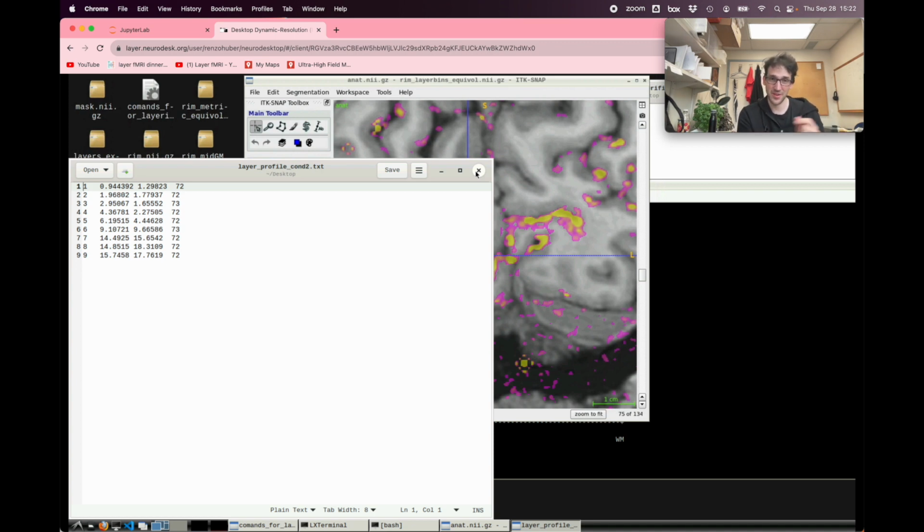Is the shape of the layer response different? We cannot really compare them layer by layer, because we know that each layer is actually referring to signal across voxels that might have partial voluming. So as Farouk already mentioned in his lecture, the layer profile extraction is usually smooth. The effective resolution is not the number of layers.